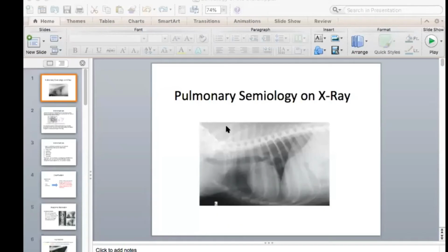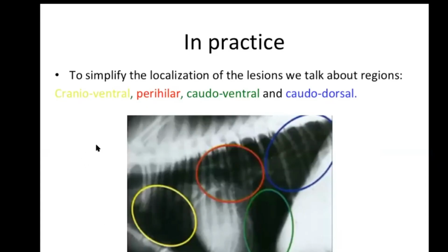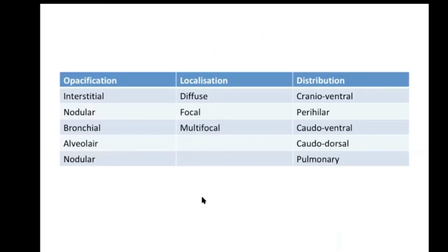Okay, we can continue. So this is just a repetition, like a summary of what I talked about. We have to say something about the opacity. What is it? This one we have to identify. I will talk about this one later. This one is what I will be talking about a lot now.